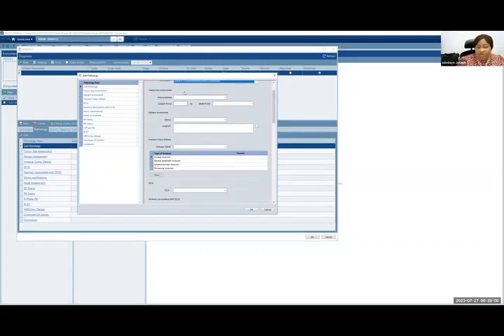Tumor size assessment will not be relevant on biopsy. If this is a post-mastectomy report we're looking at, then we should ideally put what it is. And you usually, again, it will be gross. And you can see the largest focus was 5 centimeters. Is it multifocal? Yes or no? It is no. It's a solitary tumor.